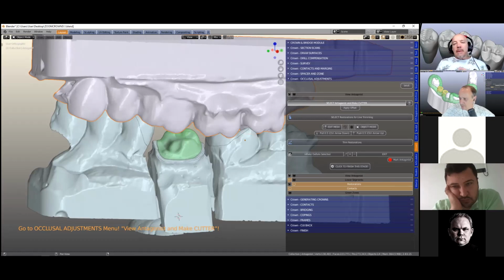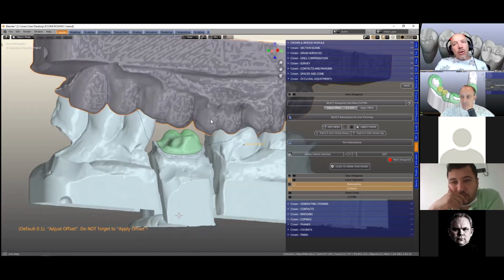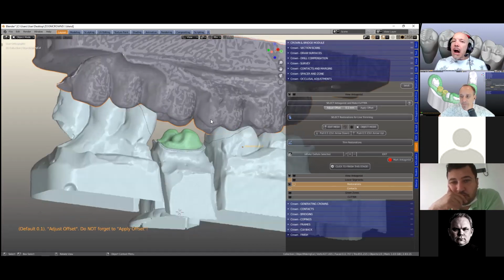Now, we all know in digital design, if you take a face and you cut it on a face, chances are it's going to be high in the bite. Okay, and I've done a lot of zirconia crowns, and a lot of them have been high in the bite, and it's really annoyed me. And I don't know why. That was before I've sent them out to other labs. And this gives us a good way of controlling how you want this to occlude in occlusion.